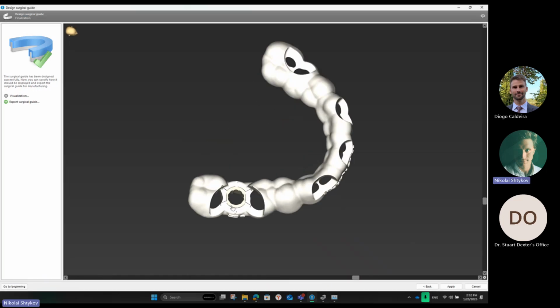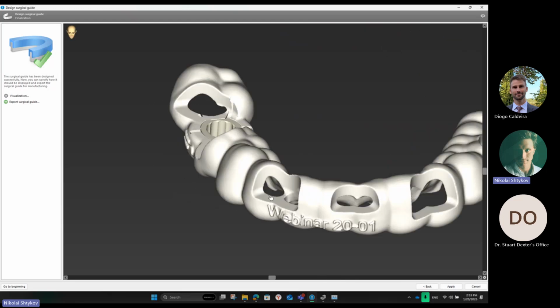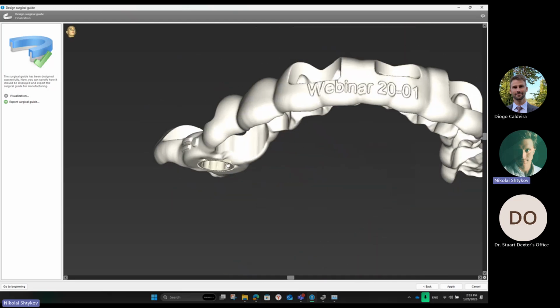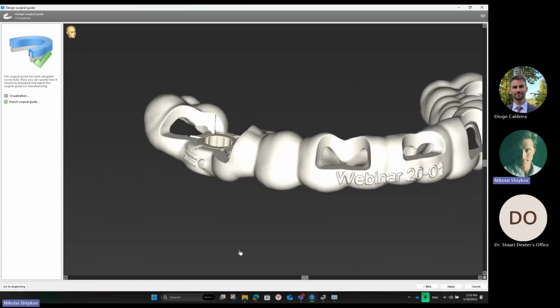And now I can see the preview of the surgical guide, the rotation markers, the sleeve here. You can see the small intersection with the soft tissue, and we can have the surgical guide try to avoid this soft tissue. And this is too small, it's not important.